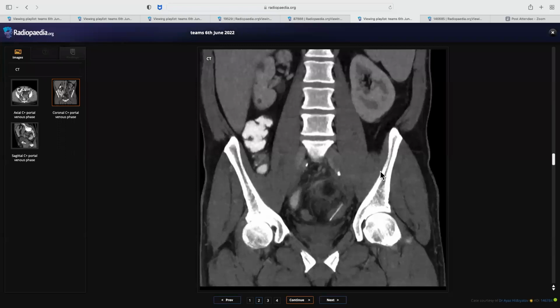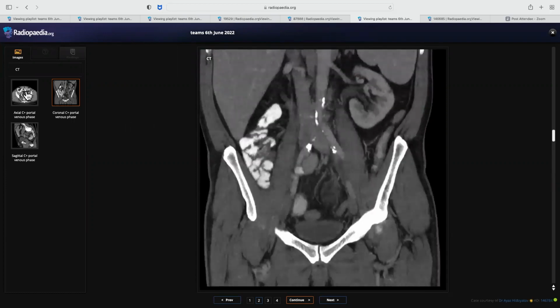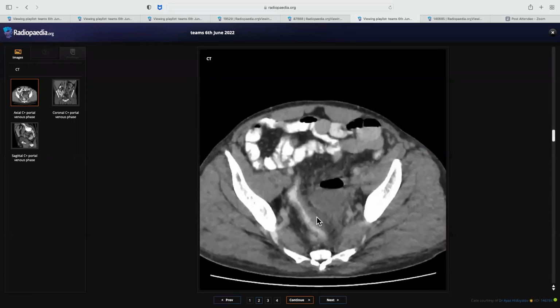As it is a very sharp object. Time is over. Okay. So very well done, doctor. This one was actually an ingested foreign body. It was an ingested toothpick by the patient, which was impacted in the sigmoid colon, thereby piercing the colonic wall, and that was a localized perforation here. So that was the cause of pain, and then it got infected, and that's why the patient had fever.